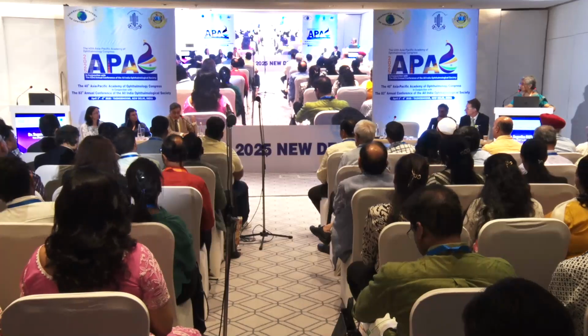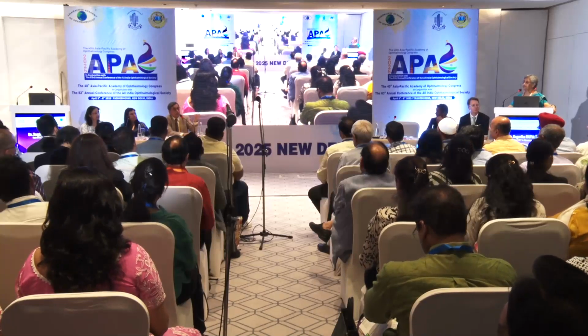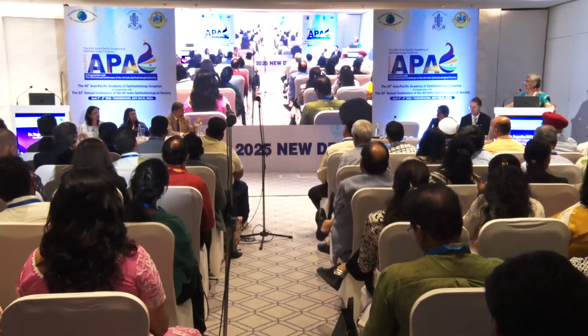I think one message was clear: when you're evaluating the OCT, check the signal strength. If the signal strength is not good, you could get a misleading picture. That's one. The second thing is, changes in OCT can give you the basics for screening with a field, which takes much longer. And thirdly, if on sequential follow-up the OCT is showing changes which are increasing, you may use it even for treatment. Absolutely. In addition to this, if there are any other questions from the house, please go ahead.